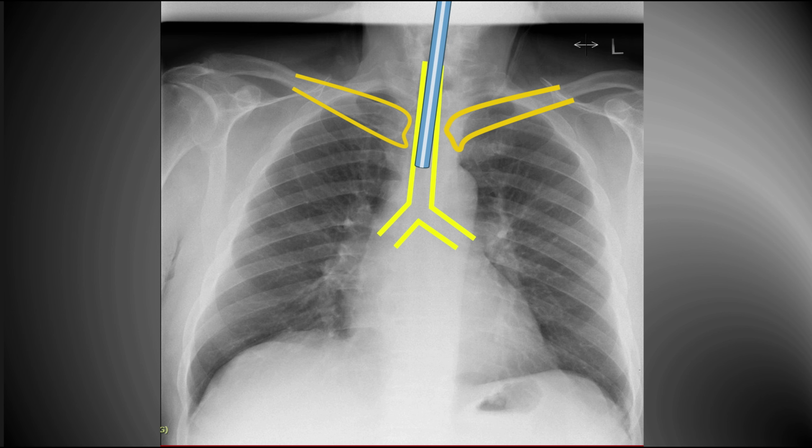We know that it's an endotracheal tube because the tube emerges from the top of the picture. It has passed through the upper airway. If the tube is located in the trachea but does not advance above the larynx, then this is a tracheostomy. Regardless of which type of tube we are dealing with, the tip should be in the same place.